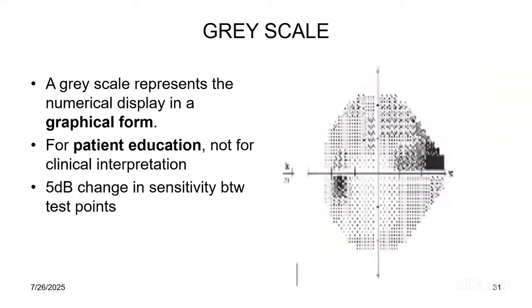And then the grayscale represents the numerical display and is usually meant for patient education. It's not usually used for clinical interpretation. It's just to show the patient that this darker area that you're seeing means that you can't see anything there. It's just to educate the patient.